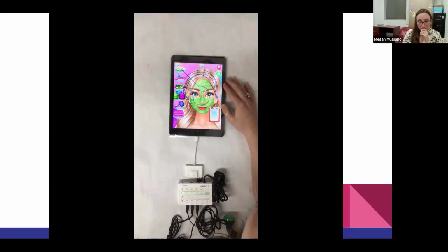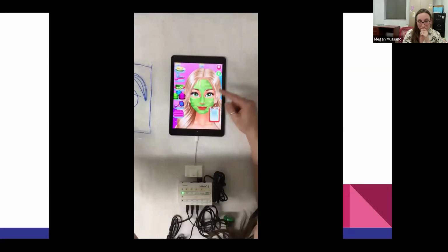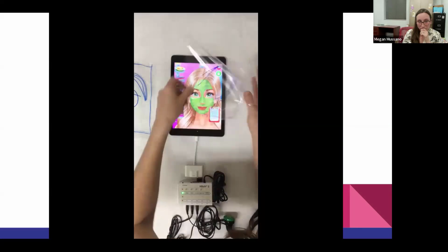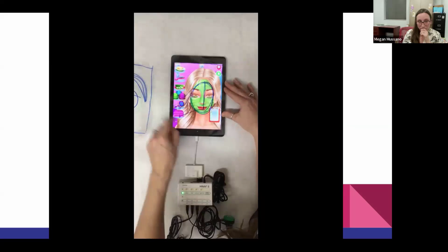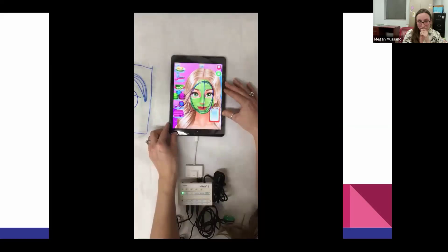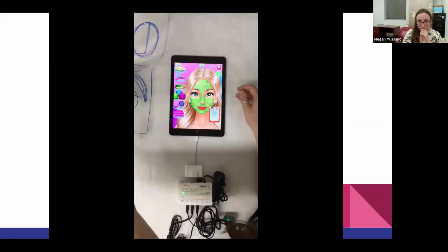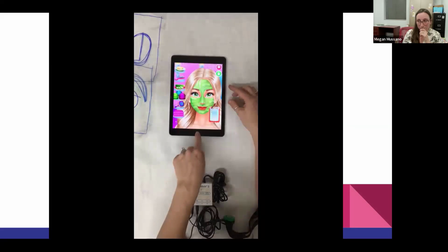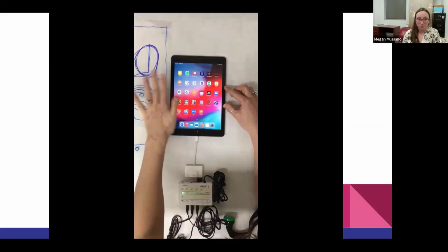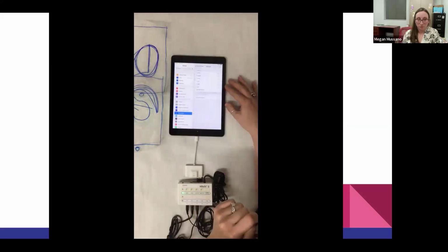So once you have your overlays made, this overlay was made for the first 3 directions to this app, and this is now directions 4 through 6. Always make sure you place a little circle around the home button so you know which way is up and down, because later you might get yourself in the wrong orientation. Once you have your plans created, go ahead to settings. Make sure you have all your switches entered.